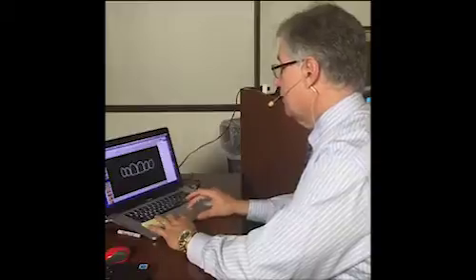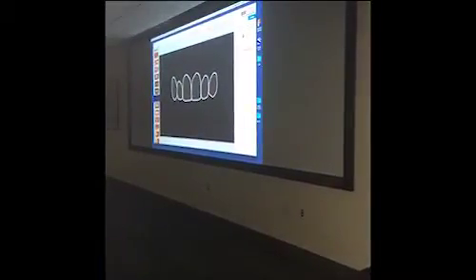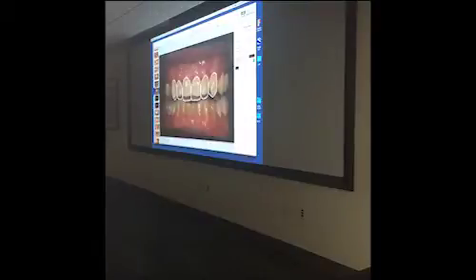So actually, just to illustrate the change, I'll show you. Let's say that I really wanted to have some big, prominent central incisors. I will come up here just to do this, just so it looks better. And all I'm doing is dragging. Okay? So let's say that I decided that this really is what I think I would like, so it looks better in his face. The next thing I would do now is duplicate the slide. Let's put the teeth back.